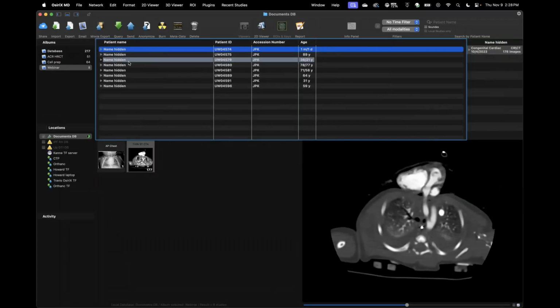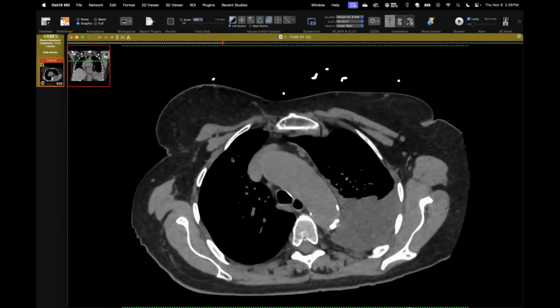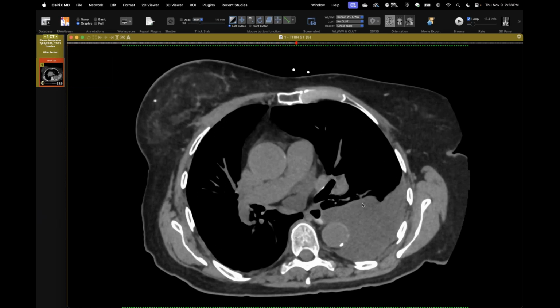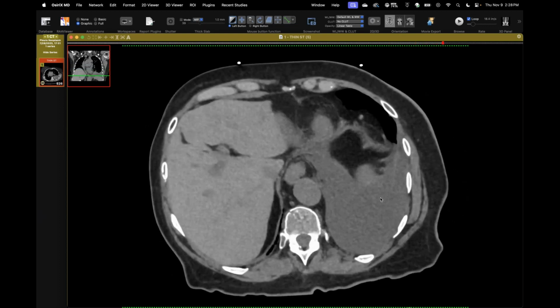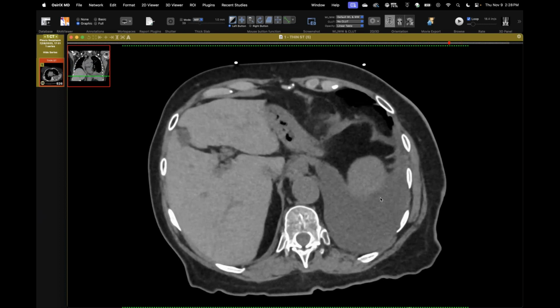All right. So this was an interesting case. This patient presented for evaluation of a persistent pleural effusion, and you kind of got this blobby effusion. It's mostly layering down here. There's a little bit of atelectatic lung, but there's really not much else going on with the pleura.